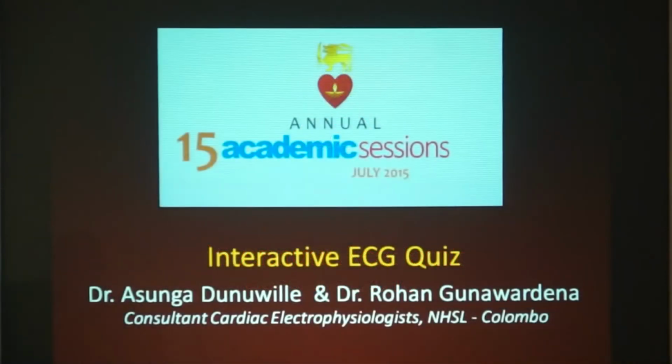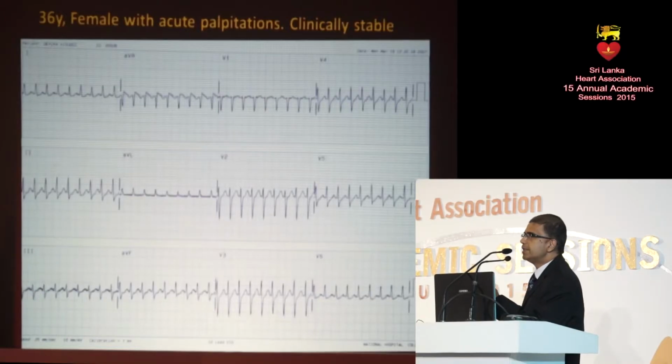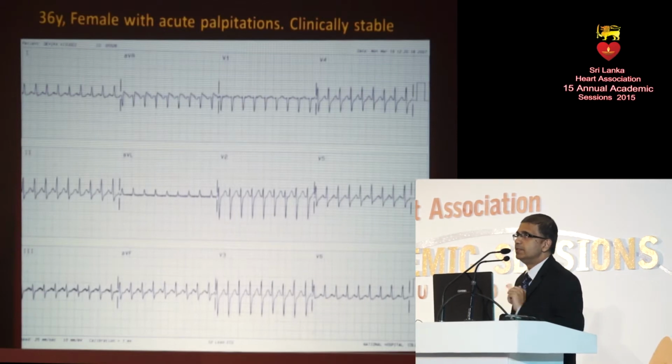So we are starting off with an extremely simple case, right? Here you have a patient, a young female who has come with palpitations. So it's kind of an acute episode, and she's clinically stable. Just have a look at that ECG.